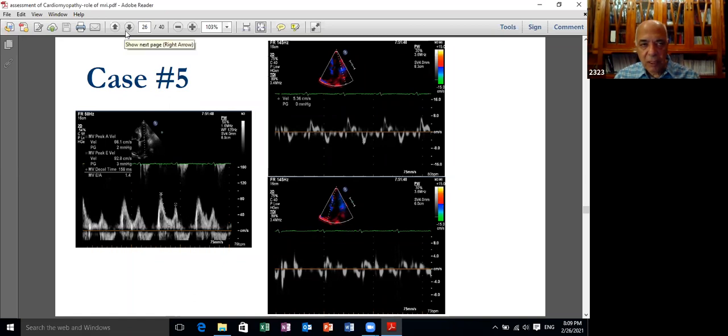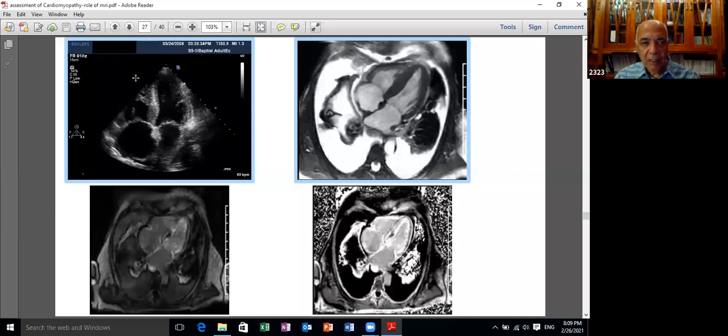So this is just in the indeterminate phase, but look at the next part of the study. This is a 4-chamber view with a speckled appearance. Now, if you look into this image, you will find this is a massive pleural effusion. It's a T2 study. Remember, T2 likes water. So whenever you find a T2 study and there is brightness and a highly intense signal, then under these circumstances, you diagnose the presence of water.